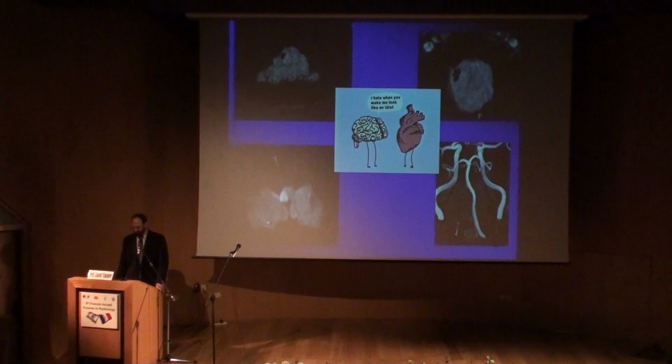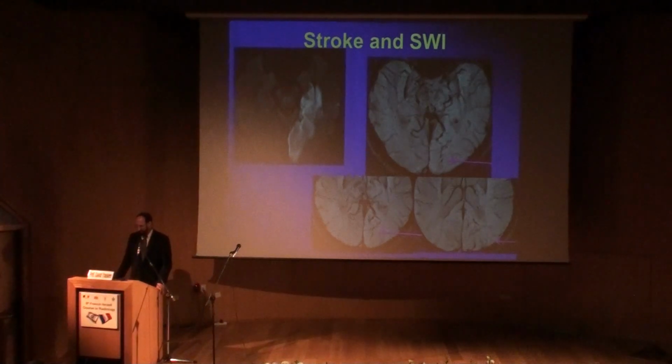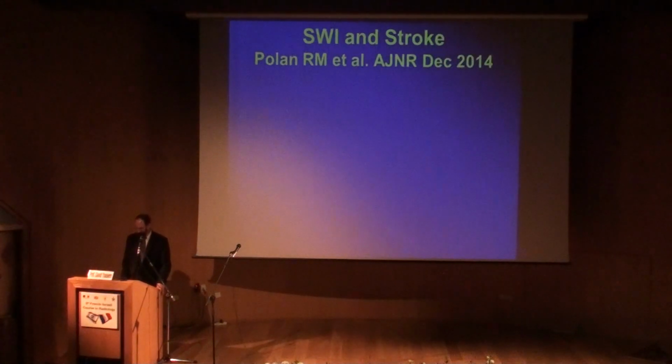Another example, this patient with a Wallenberg syndrome, a posterior inferior cerebellar artery infarction of the lateral medulla, and once again, blooming effect within the clot that occurred within the vertebral artery. And you can see the normal left vertebral artery and the occlusion of the V4 segment of the right vertebral artery demonstrated again by the blooming effect on the susceptibility weighted scan. And yet another example of that.